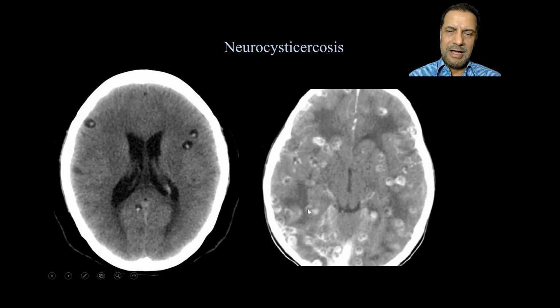This is active edema. Active means, in my experience, these cysts are dying. So they release their chemicals outside, and then there's an edema. So that's the time when they have neurological deficit or seizure.